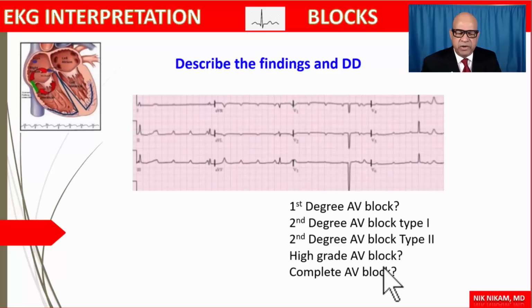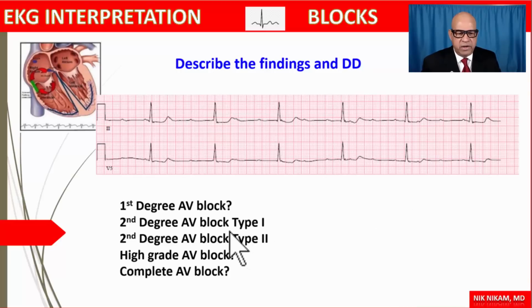When we are talking about complete AV block, we have to understand that there is significant disease involving the AV node, and complete heart block is a much more serious problem than a first degree AV block or a Wenckebach block. Next.